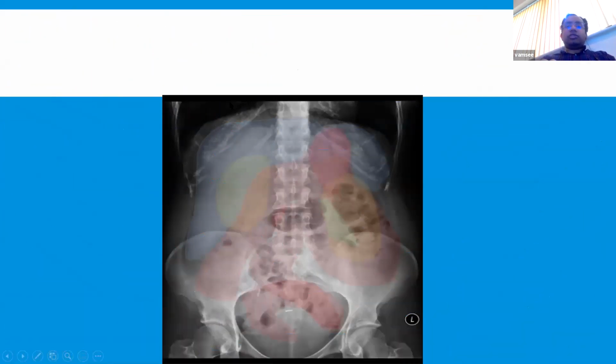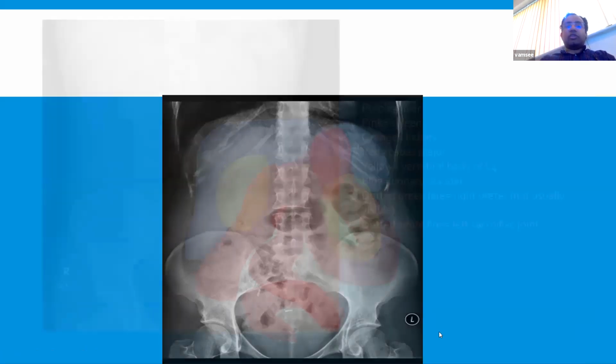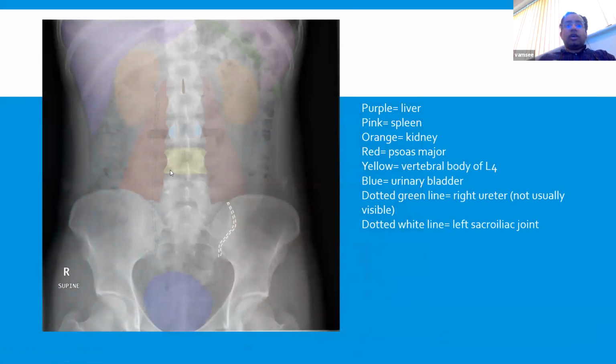Soft tissues and organs, there's the sort of things you can see, often not very prominently unless there's something wrong going on, but you can see the spleen superiorly. You've got your transverse colon with the splenic flexure and hepatic flexure being particularly important to note, and your kidneys. You've got your bladder inferiorly, which I haven't really highlighted, but that's not something you need to worry about too much.